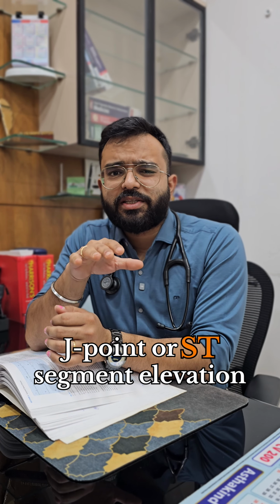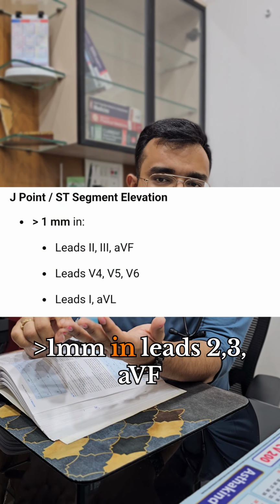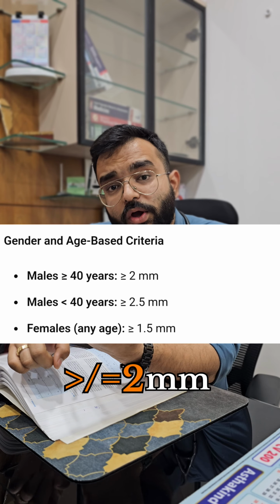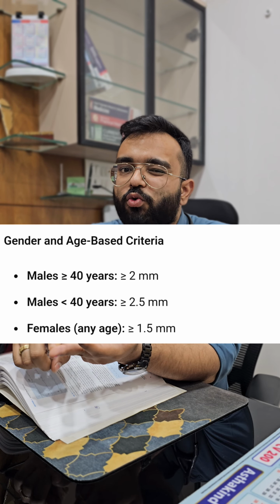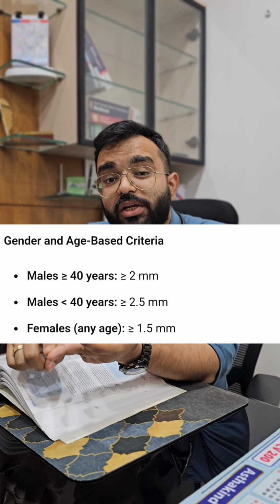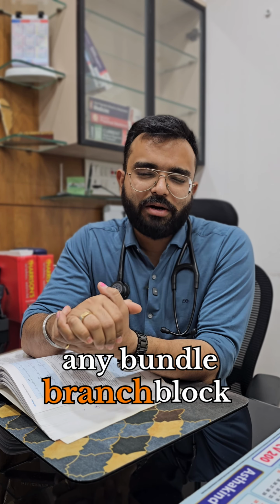Coming to J point or ST segment elevation, there should be upsloped elevation of the ST segment, and it should be more than 1 mm in leads 2, 3, AVF, 1, AVL, V4, V5, V6, or greater than or equal to 2 mm in leads V2 and V3 in males more than 40 years, greater than or equal to 2.5 mm in leads V2 and V3 in males less than 40 years, and greater than or equal to 1.5 mm in females. But all this is in the absence of left ventricular hypertrophy or any bundle branch block.